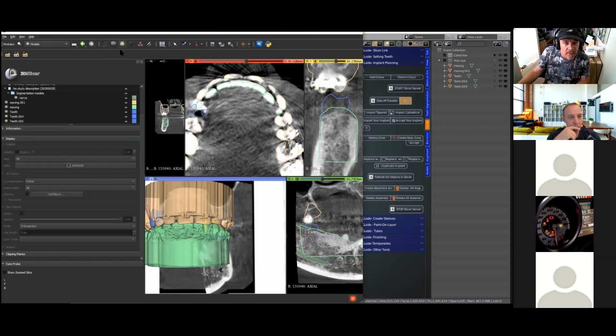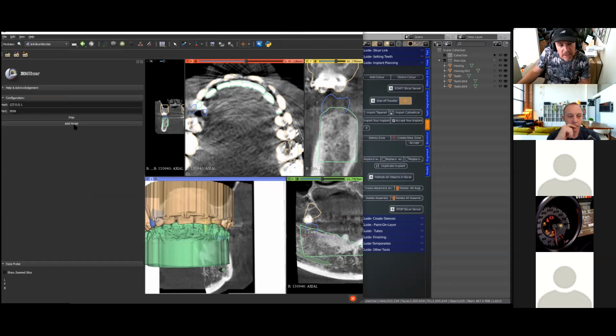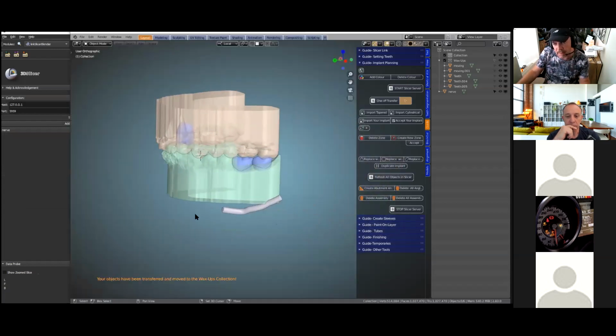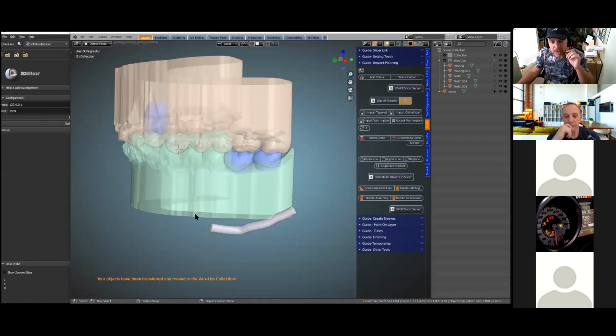Then on the model maker, we've got it called nerve over here. So again, you don't have to do this, but if you want to have it in Blender for future reference or something, we will then go to our link and we're going to add model and we're going to then look for our nerve. And then this will then port it across into Blender. Okay, so we've got it over here. Okay, so this is how we do the nerve.